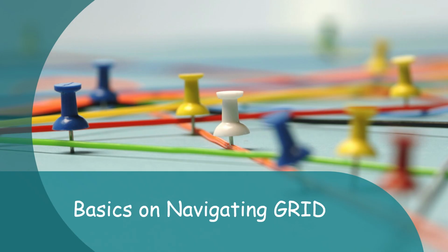And the thing with Grid and with all the different AAC apps is that there's no specific training as such. You have to watch the videos and learn as you go along, as the child learns. So let's have a little look at how to navigate the Grid.